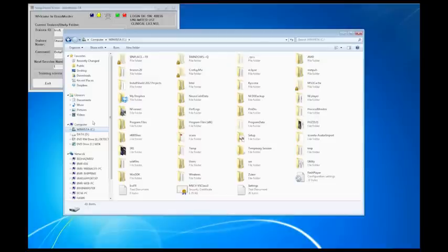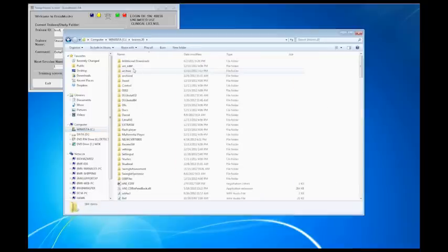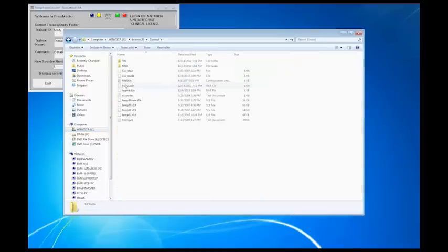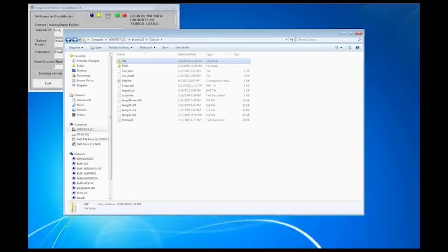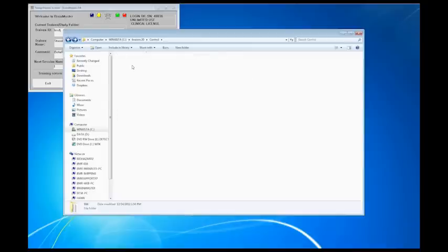For the BrainMaster 3.0 software, it's going to be located from the C drive, BrainMaster, Control, and then in the capital S, capital W for software, or Session Wizard. So this is where those Miniq or those MQT files are going to be stored so that they can have access and be able to use them. In your Discovery software, it's in the folder SWD for Session Wizard for Discovery. So if I double click, that is where my Miniq files are here.